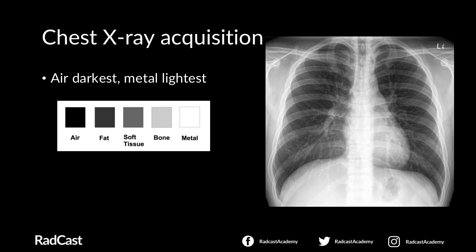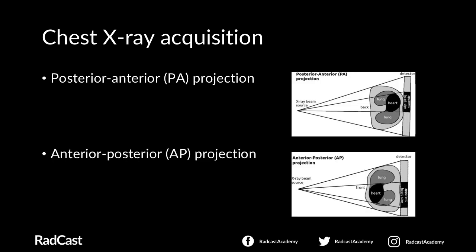I don't have a chest x-ray here with something like a metallic valve in situ or a metal surgical plate, for example, but I'm sure most of us have seen x-rays with some kind of metallic structure on the image, which is obviously displayed as bright white. And there's a small diagram on the left of the x-ray as well that is quite generalised, but it just gives a brief illustration of the colours that we can expect in the end image related to the density of the material concerned.